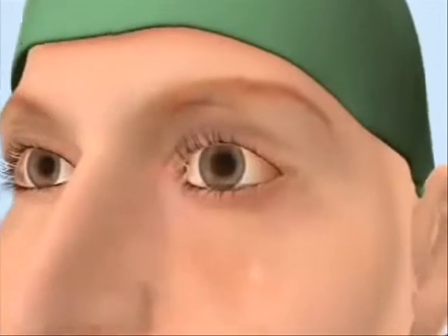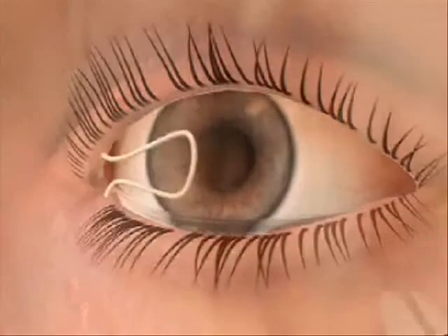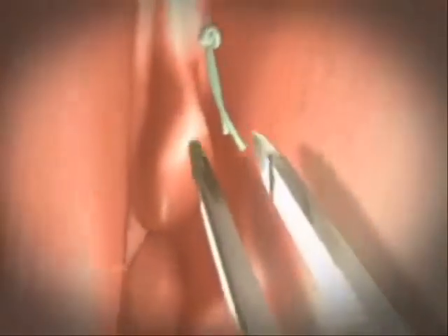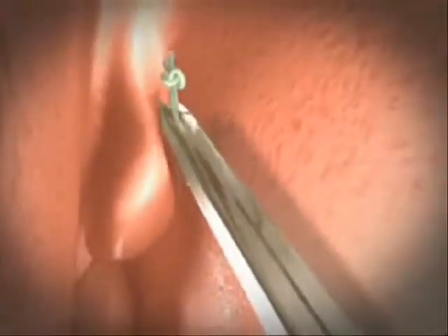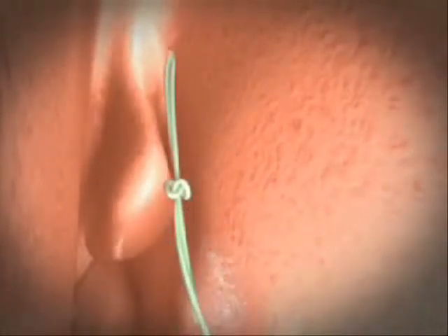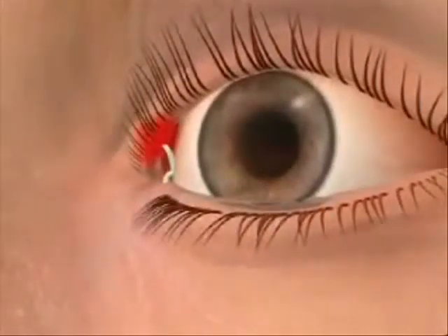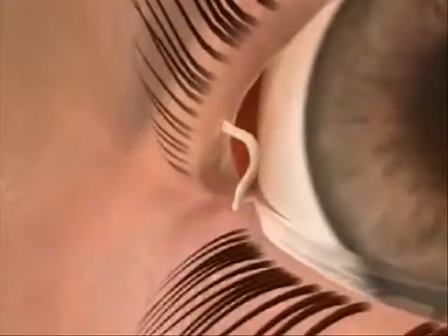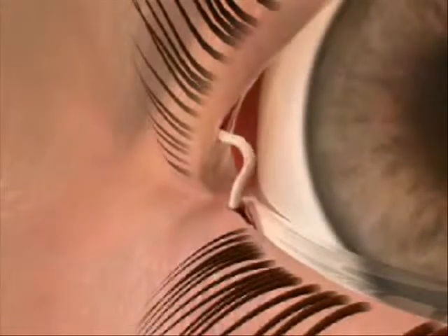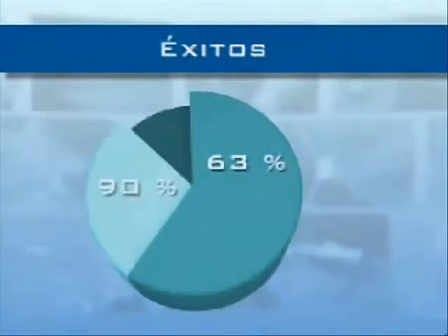Another complication we describe is lateral displacement of intubation. This can be easily resolved with the endoscope, and is relatively unimportant if the tubing is withdrawn early and periodical washing is performed. We suggest early withdrawal of intubation at 3 weeks to prevent granulomas and duct laceration, and to obtain the best possible outcome. The success of this technique is between 63% and 90% according to various authors.